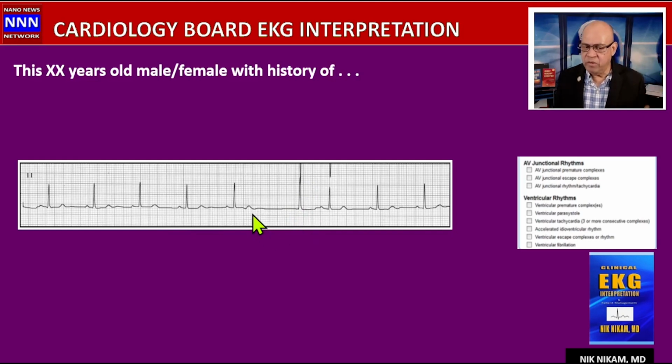Why am I concerned about blocked PAC? Having dealt with thousands of cardiac surgery patients, when I see PACs, I get more concerned, because the next thing you're going to get called for is a patient with atrial fibrillation with rapid ventricular response. As I have seen time and again, PACs are not something that we want to totally ignore. That's just some extra clinical point, but I'm giving it to you in the context in which we need to be looking at the whole picture. So that is an escape junctional beat following a pause.